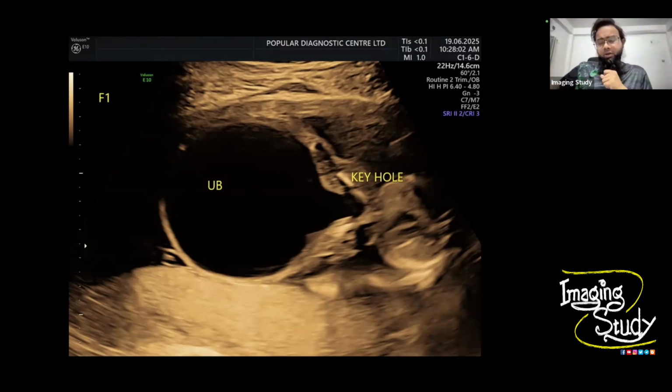So, okay, now the problem is that the patient is at the age of 18 weeks. So if you want to manage this patient, you can put a shunt over here, an amniotic and bladder shunt, through puncturing the urinary bladder. You can get that video and procedure in Google. So that may give a relief of this pressure.